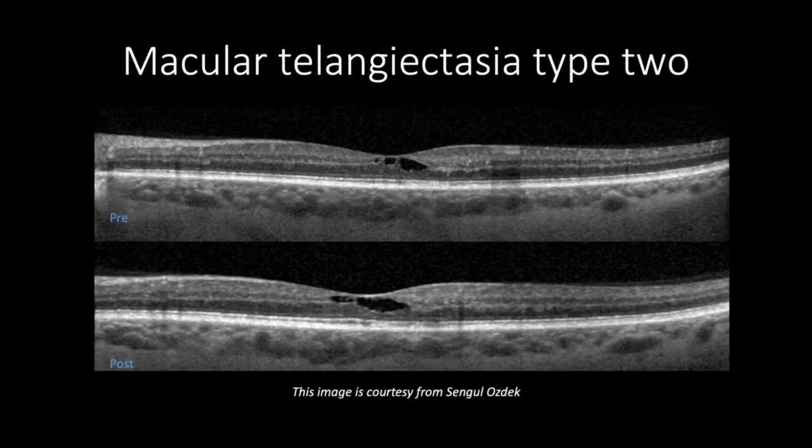As in this case, the baseline scan shows intraretinal cavitation, and within 5 months of follow-up there is an increase in intraretinal cavitation.